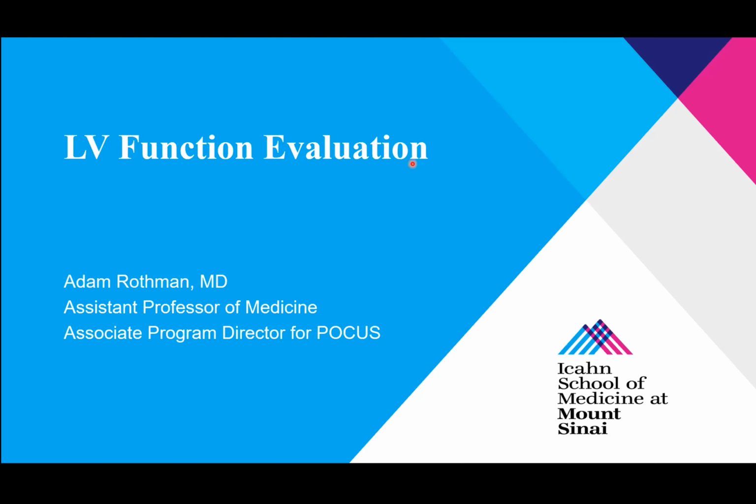Really we're going to go through the main cardiac views again and discuss how we evaluate the function in each of those views. And after a quick review of that, we'll have a series of clips where audience participation is strongly encouraged. We'll have a poll where you will be assessing the function for each of the clips. We have about 15 clips, so if we can get some good audience turnout, that would be excellent.